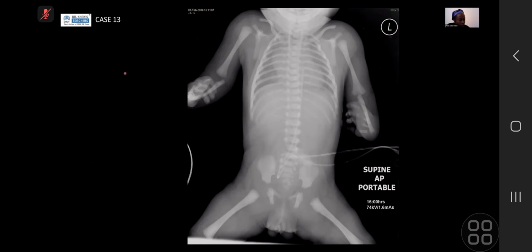Okay. Just before you move on, candidate 3, what are the correct positions for the umbilical arterial catheter and the umbilical venous catheter for those who don't know in the audience? The umbilical arterial catheter has two positions, high level and lower level. High level should usually be above D10.